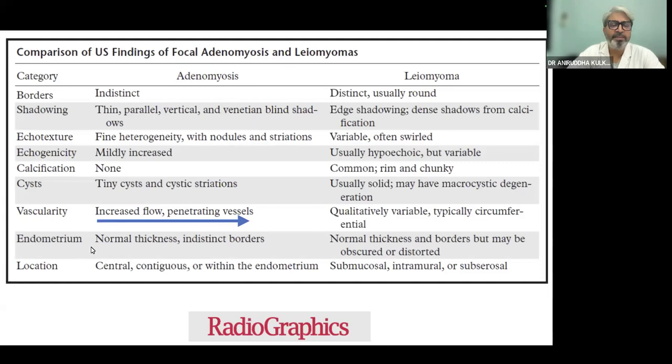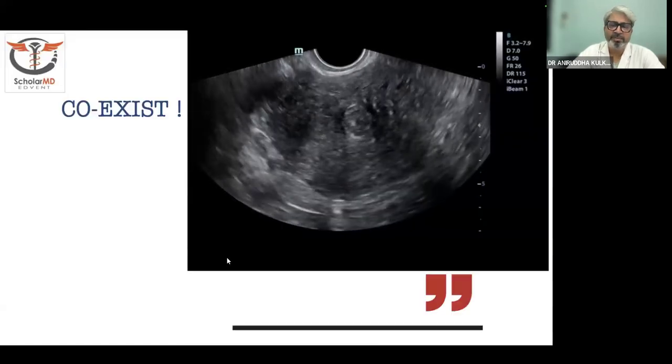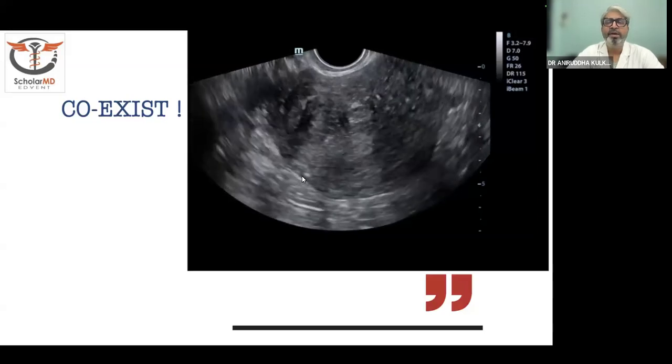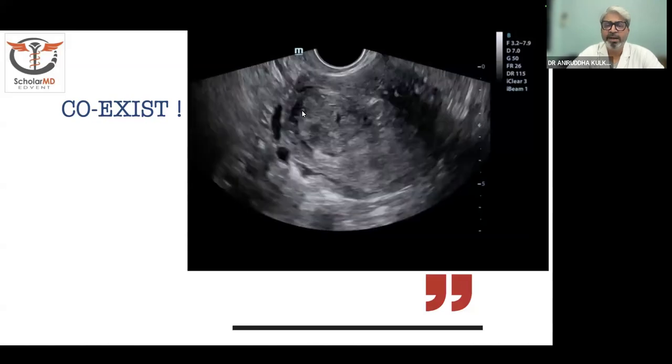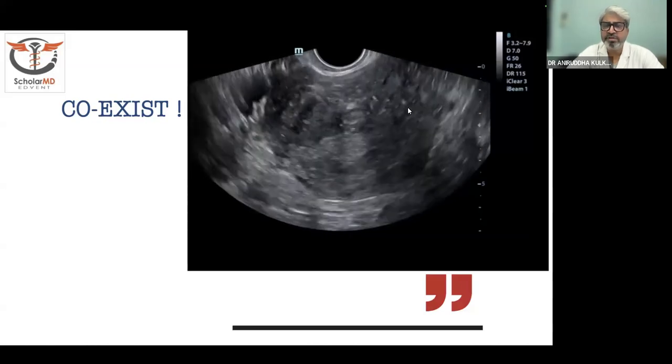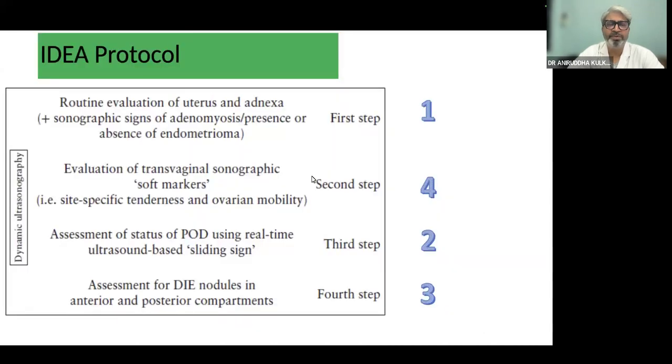The endometrium can be normal, but the endomyometrial junction zone is thickened and it may be irregularly interrupted or indistinct in outline. So we need to identify the fibroids and adenomyosis. At the same time, we also should consider that on many instances, fibroid and features of focal or diffuse adenomyosis can coexist in one patient.